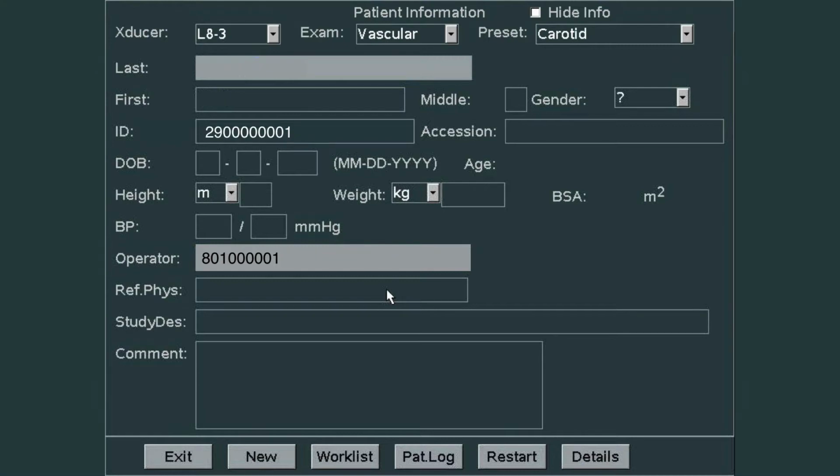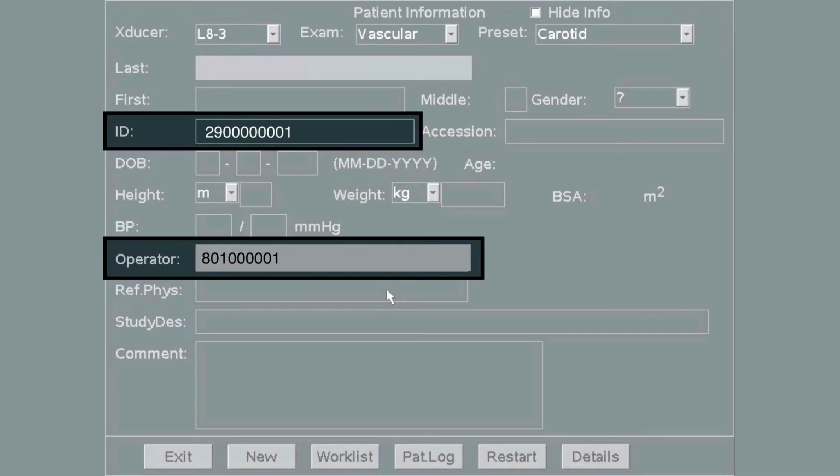If not using the barcode scanner, you can manually enter the ID number for the patient and the operator and supervisor into the slots. ID number, meaning the ECD or FIN number, will be placed in the ID slot, and the ID numbers of the operators will be placed in the operator slot. The information will then be used to drive all the information into QPath. If you have multiple operators, separate them by a comma.